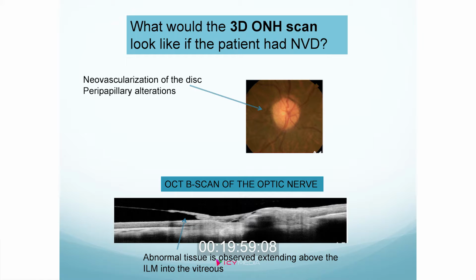And the reason it's missing is because there's that superficial fibrovascular membrane there that's extending from the inner limiting membrane anterior into the vitreous. That's substantiating or confirming the presence of NVD on this nerve. Okay, so here's a case where maybe you didn't know, were they collaterals, are they deeper vessels? Here the OCT would confirm that they're actually superficial vessels and they're NVD.